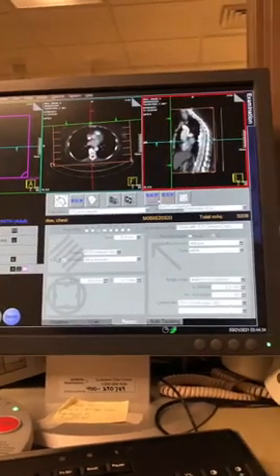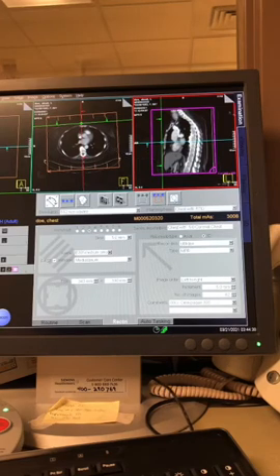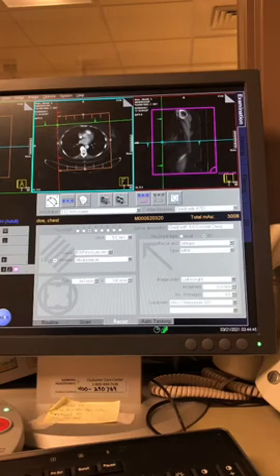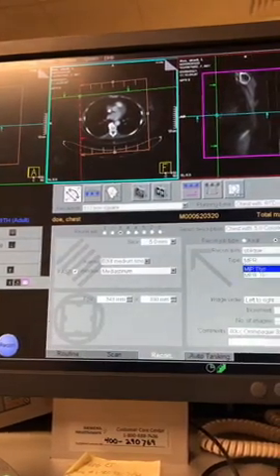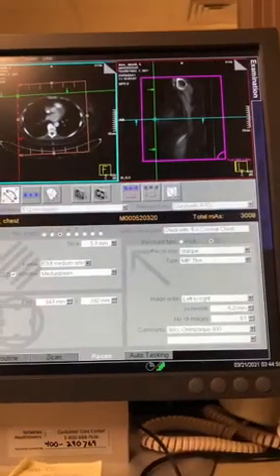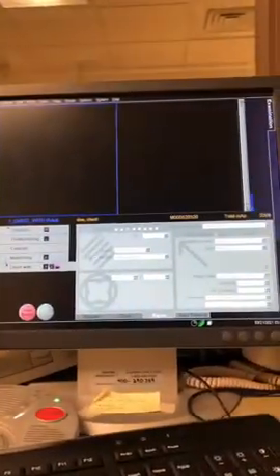You guys, I can't teach you how to do this, but I'm gonna go ahead and do it and show you how fast it is. Right, so there we are. Now it's a sagittal. Bring it on in, and then there it is. We got 5mm slices with a 5mm increment. It tells us how many images. We got an MPR. Let's do a MIP for the hell of it. There we go. That's more for PEs, but we'll go ahead and do it on this, and then we're just gonna come over here, hit the recon tab, and it's gonna spit it out.